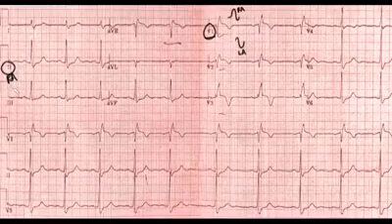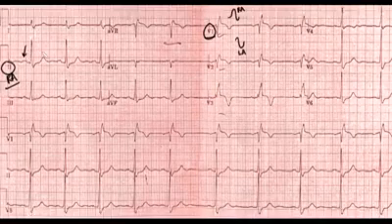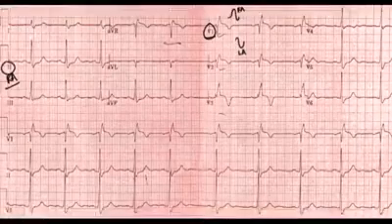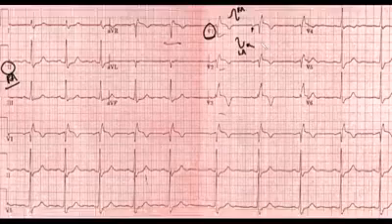So let's start from the beginning. Right atrium should have a peaked P wave. We don't see that there. Right atrium should also have a large positive component in the P wave in lead V1. We don't see that. So right atrium is a negative. Let's go on to left atrium. As we mentioned, the left atrium should have a large negative deflection. We may be seeing that a little bit here, but it's got to be bigger than a box, so we're not seeing that much. So no on the left atrium.